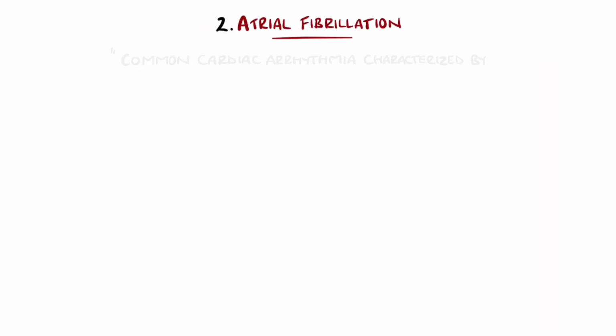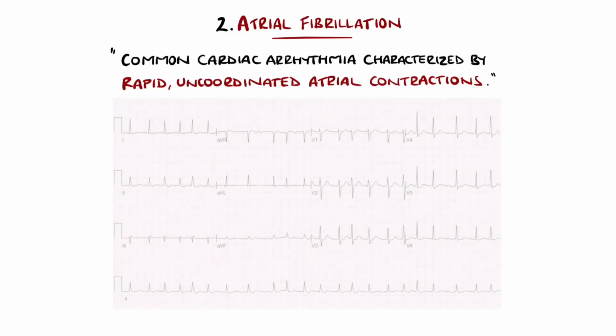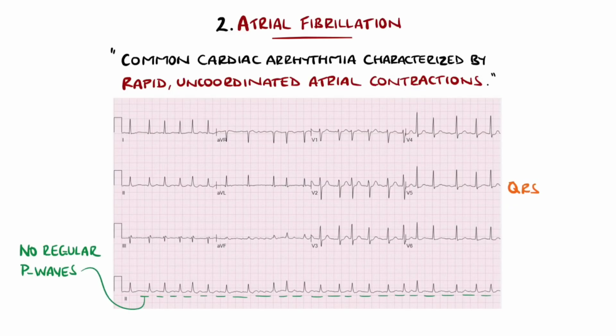In this case, there is abnormal electrical activity that leads to the atrial muscle fibers contracting at different times. It is these uncoordinated contractions that give the quivering or fibrillating activity. The ECG, therefore, has no clear P waves, with QRS complexes not being preceded by a P wave. Although the fibrillations can somewhat resemble a P wave at times, they will not be consistent.